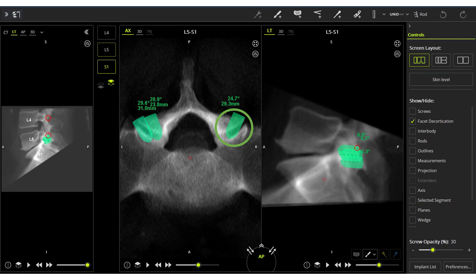injury to neural structures. Additionally, two numbers are displayed, one in millimeters indicating the entry point's distance from the midline, and an angle in degrees representing the burring channel's current angle relative to the midline. The defect model has a fixed diameter of 7.5 millimeters, while the depth is adjustable between 8 and 20 millimeters for precise planning.